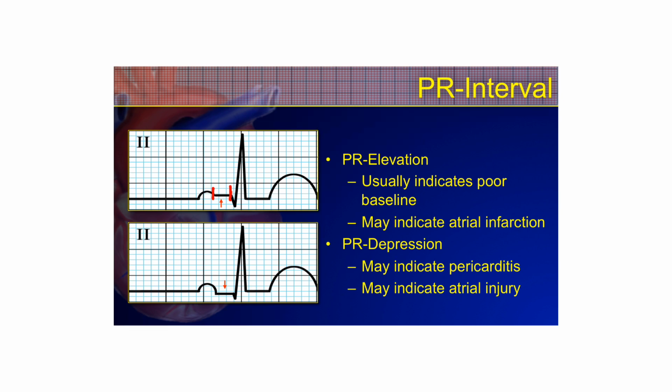It's all about the company it keeps. Look at your patient. Is your patient sick? Is your patient presenting like somebody who's infarcting? But this isn't something where you would call a STEMI, because, again, that's not the ST segment, and that's what the ST in STEMI stands for. So it's just one of those things to help you when you're identifying patterns. You may see something like this.